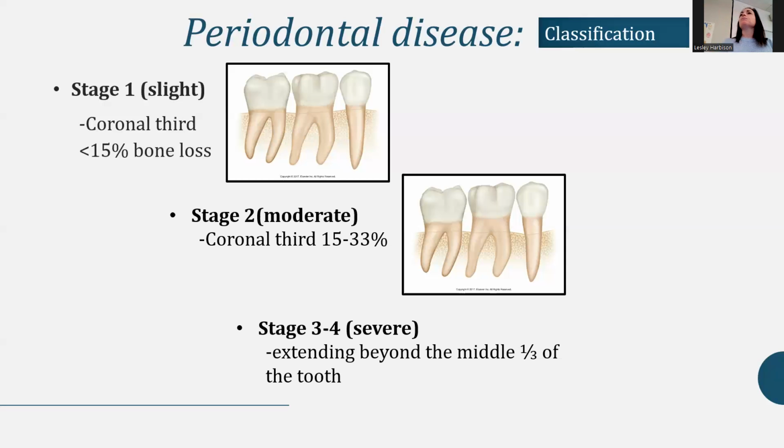With our imaging system, can we get a ruler out?